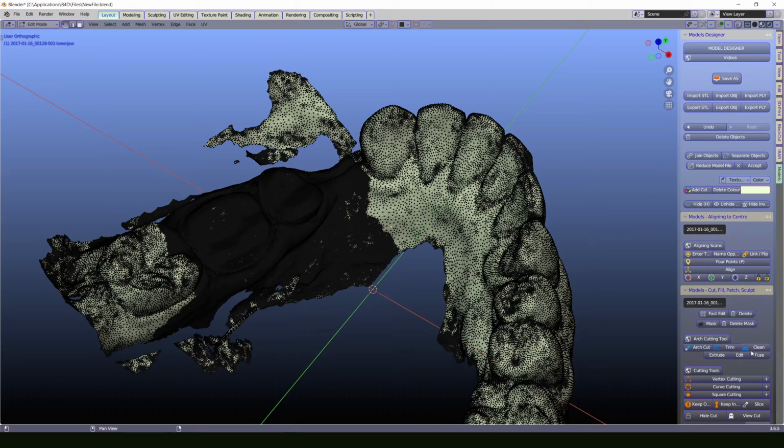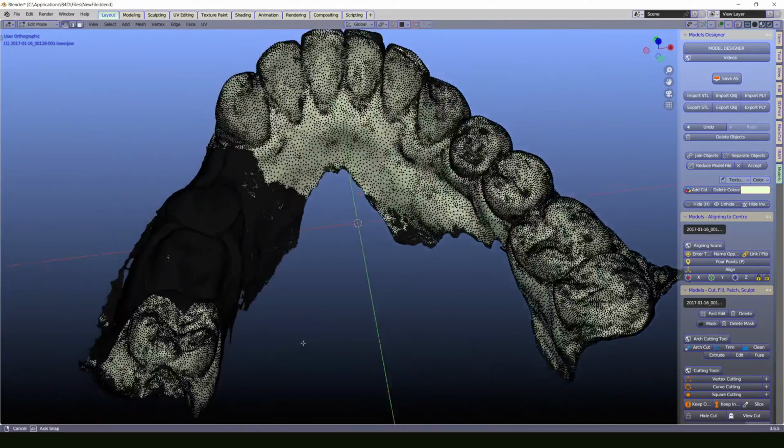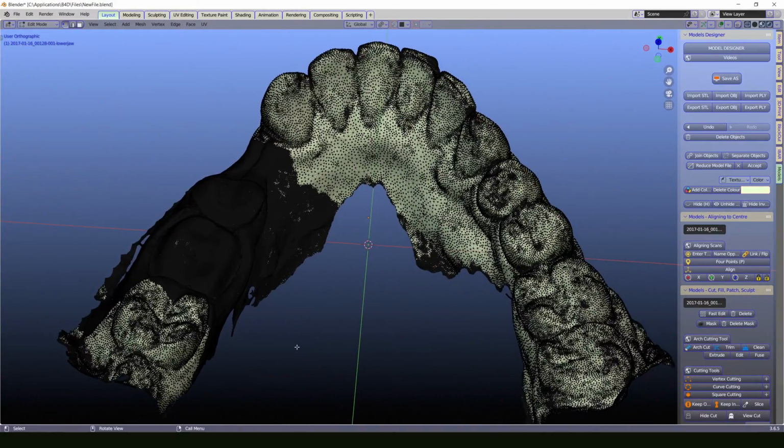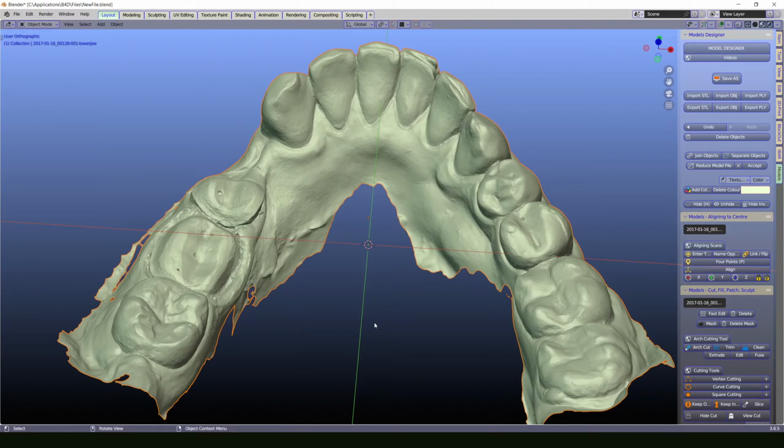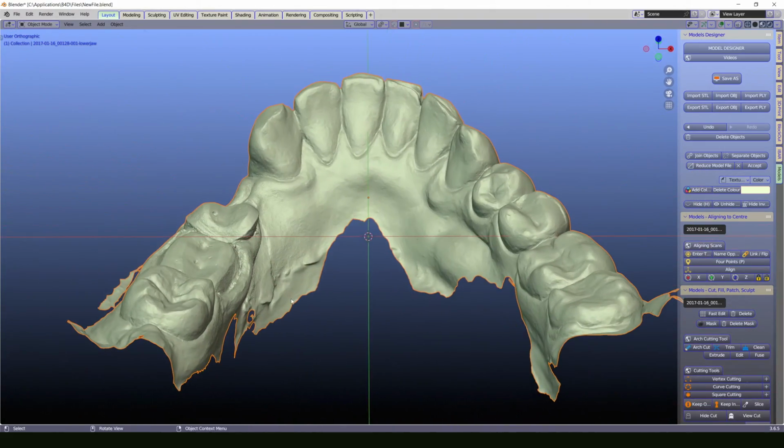And I click clean. Voila, amazing. Let's go back by pushing the tab button and use another amazing function we need for our scan file to be selected. And let's push the button close all holes.